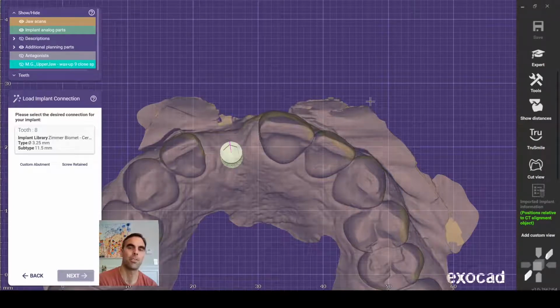All right, welcome back. So this is just a quick follow-on video to the tutorial about tooth mirroring. And it came up in the video that mirroring number 8 and 9 created a diastema.